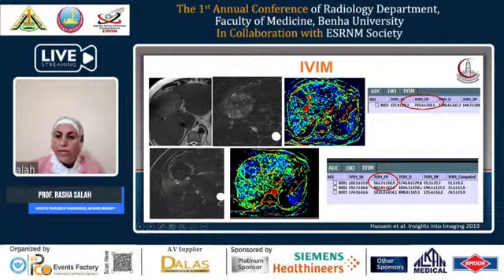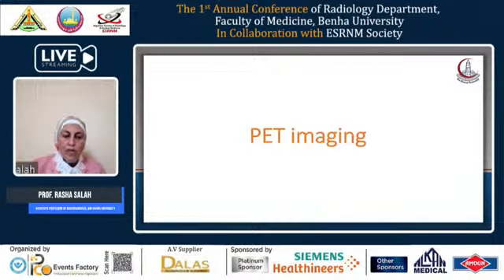Also, the cellularity of the lesion, which is measured by the D value located over here, is also showing an increase in its number, which means that there is less cellularity noted in this lesion, and this is a well-treated lesion, and it is a potential tool to be used in patients, especially those having renal disease.